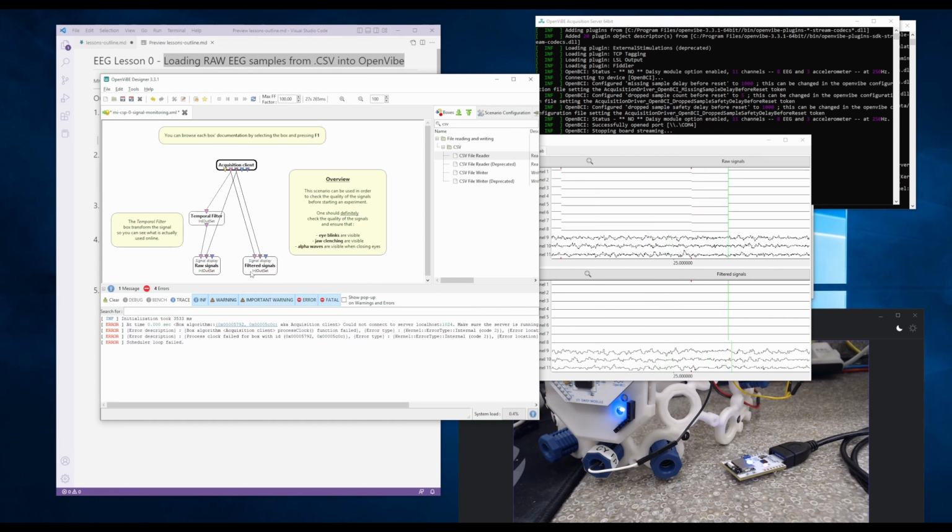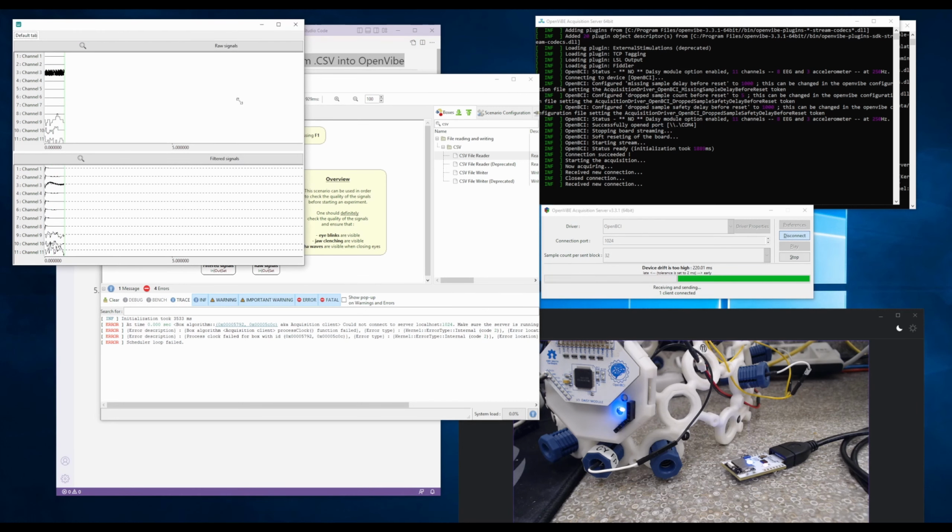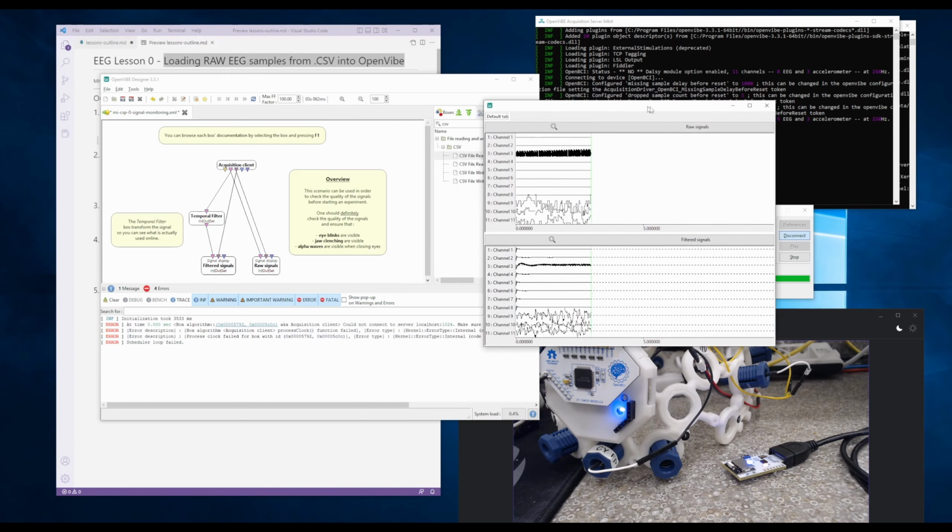But so this one going directly to the signal display. Well, this is confusing. Let me just stop that. You can just select the connections and delete them. So this one go like this. All right. Now let's try it. Yeah, it makes more sense now.